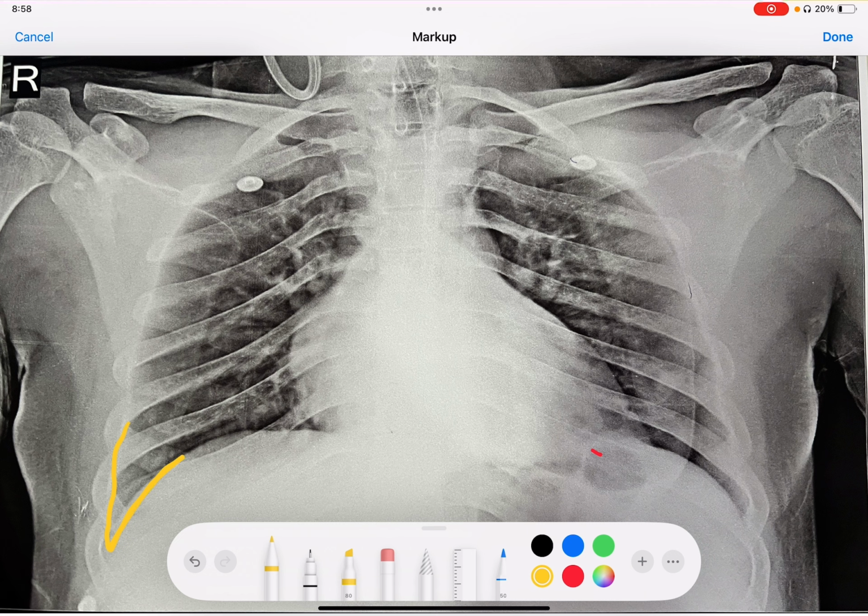So this is the diaphragm, this is the diaphragm, and these are the costal margins, so rib margins. So we can very clearly make out that both sided costophrenic angles are open, means there is no effusion. So effusion is not there here also, here also. If you try to see the lung margins here, we can very clearly make out that lung is spread almost up to the costal margin here.